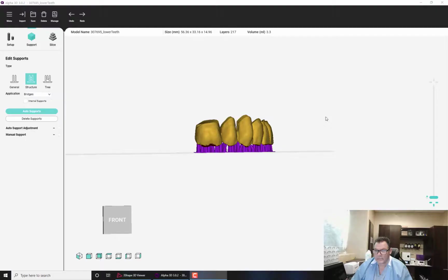Okay, so it turns out there's a bit of a paradox when it comes to printer math, in that the amount of time it takes to print a layer is fixed. For example, I know that using this resin, printing in fine detail, it'll take me about 16 seconds per layer to print this object. And it doesn't matter if I duplicate this object 3 or 4 times on the same build plate, it's going to take the same amount of time to build all objects as it does the first one, because the time is in the platform moving to the next position is what takes the most time. The cure happens very quickly.